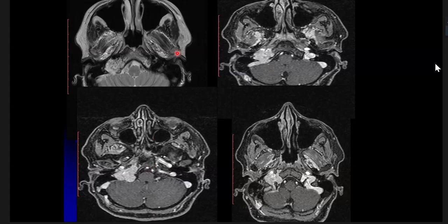So how you differentiate jugular paraganglioma, meningioma, and schwannoma? The paraganglioma will have salt and pepper appearance because of vascularity, heterogeneously intensely enhancing. What about the schwannomas? It will have little heterogeneous appearance with the cystic areas. Okay. Does it cause bony destructions like this? No, sir. It will cause mass effect, remodeling, unless it's a malignant peripheral nerve sheath tumor.